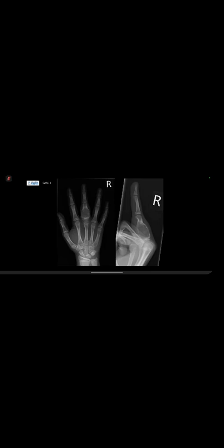Yeah, so I'm given the frontal radiograph of the right hand of a skeletally immature patient and a corresponding lateral image of the middle digit. I can see that there's a well-defined lucent lesion in the proximal phalanx of the third digit, causing bony expansion and cortical thinning.